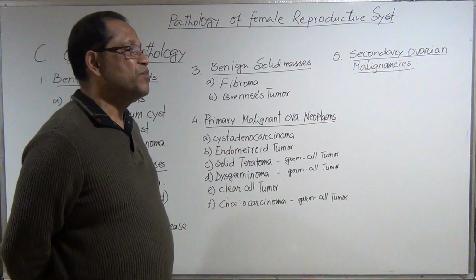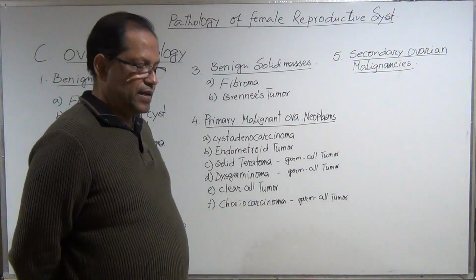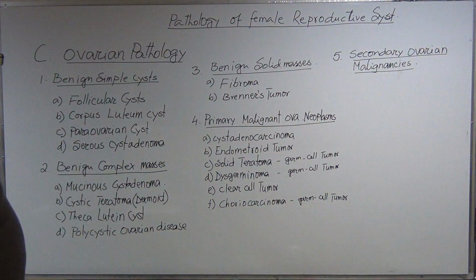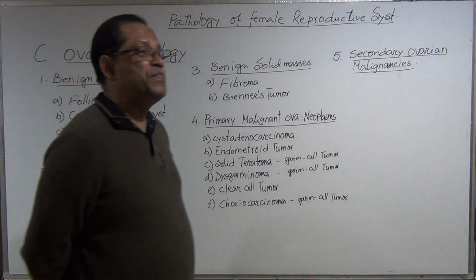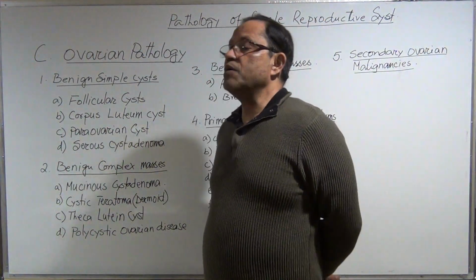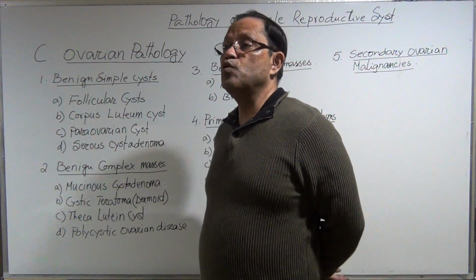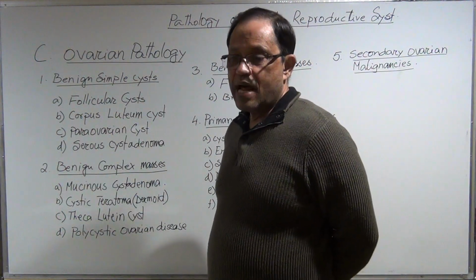And typically you might see the tri-stripe, triple line inside the uterine cavity. Okay, so a follicular cyst can also be more than 2 centimeters. Sometimes ovulation does not take place and it keeps growing bigger. It can be up to 5 to 6 centimeters. And what happens after that?